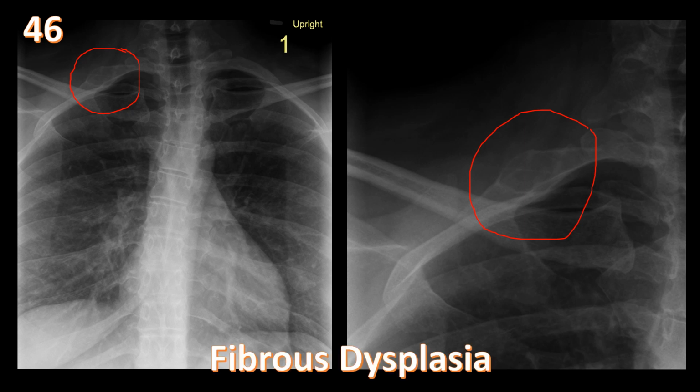And the ground glass opacity is pretty much pathognomonic of fibrous dysplasia and is very common in the ribs as it is in the bones of the pelvis, especially the proximal femur. So things you need to remember about fibrous dysplasia: it can be monostotic or polyostotic in multiple bones. Polyostotic, you have to think of several syndromes like McCune-Albright with café au lait spots and precocious puberty. Also, it can cause deformity when it's in the femur, like a Shepherd's crook deformity. So ground glass opacity, ribs, proximal femur, Shepherd's crook deformity, McCune-Albright, all those things you need to remember when you see this lesion.